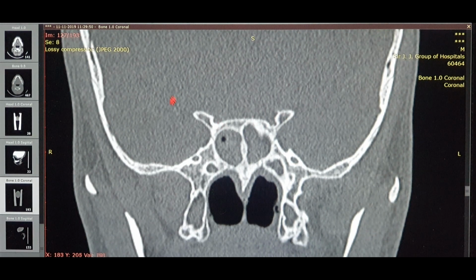Now you cannot see everything on the CT scan, it's the same, homogeneous, like a grain of sand-like structure. You cannot differentiate any structure out here, because this is a bone window, so you cannot even see the soft tissue properly. So if you're given such a scan, how you can identify the optic nerve is just follow this anterior clinoid process. Wherever you see this cup-shaped depression right here, that is nothing but the optic nerve itself. You can see it very clearly over here.